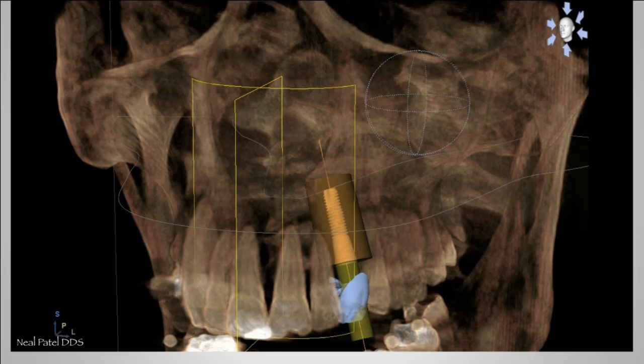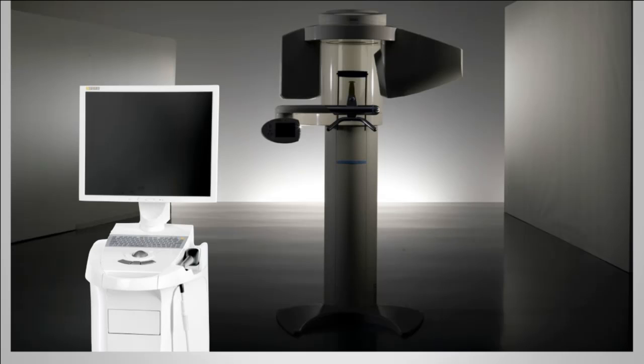Integration is a concept where a clinician has the ability to scan a patient in 3D with cone beam and also scan a patient intraorally with CAD/CAM for the design of prosthetics. When we integrate these two technologies together, we are able to take data from the CAD/CAM machine and data from our cone beam X-ray and combine them together, we have a more seamless opportunity to treatment plan our implants and project our treatment guidelines for our patients. And today I'll share that concept with you. In order to integrate both of these technologies, certainly one must take a cone beam scan and a CAD/CAM impression.